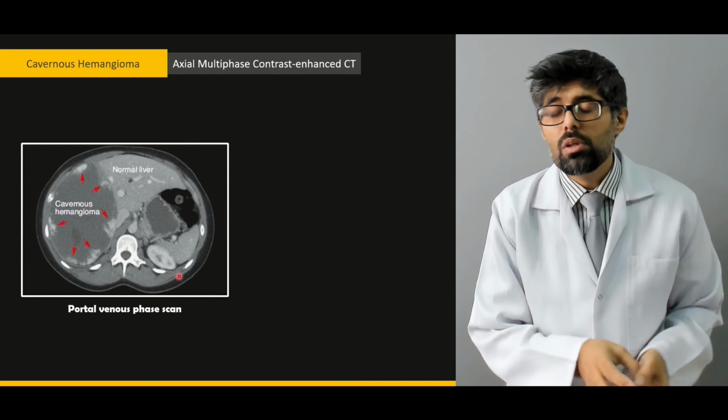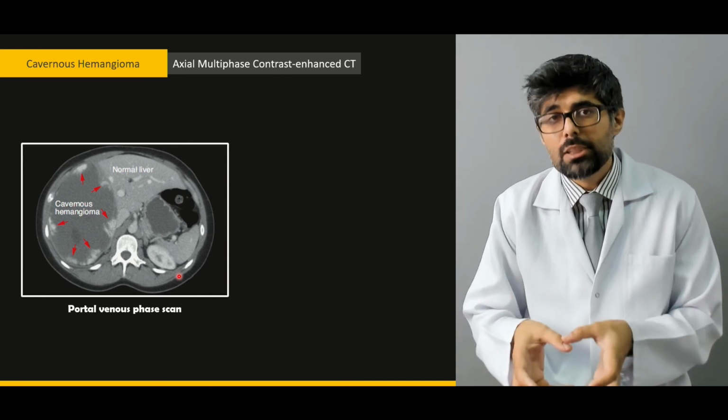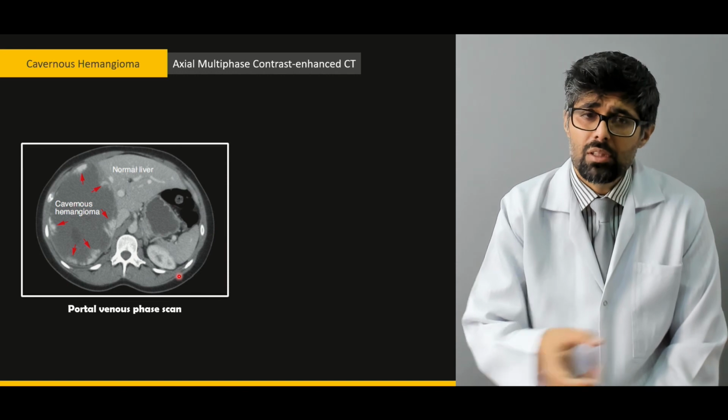Now, in this portal phase scan, we can actually find out the blood that is present due to the portal vein inside the liver.